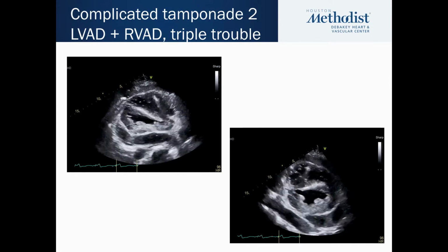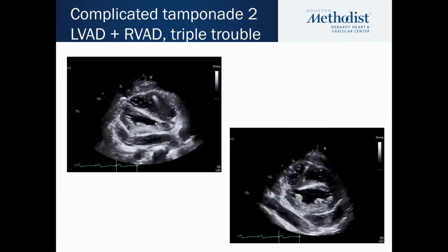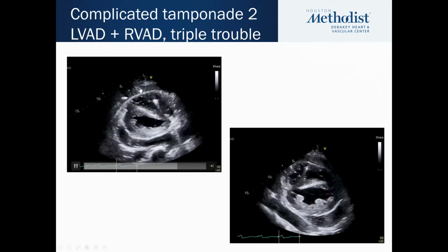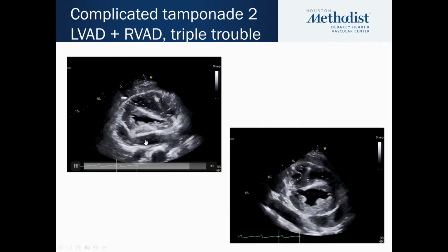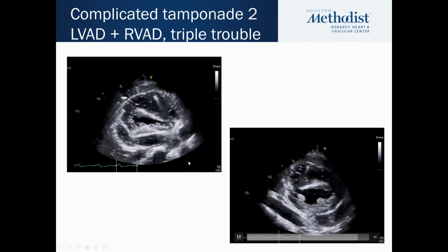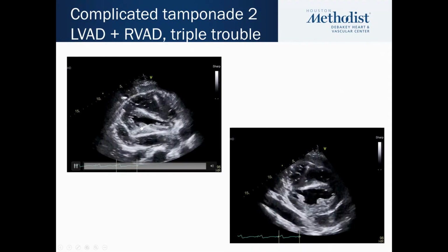reopened and treated. This is another extreme patient with an LVAD who had severe RV failure right after implantation, needed an RVAD as well. Notice this collection here. Notice how it's complex. It's not pericardial fat for sure. There's another fluid collection here, and notice the organized, if you will, nature of it. And notice how the LV is the one who's being compressed at this point.